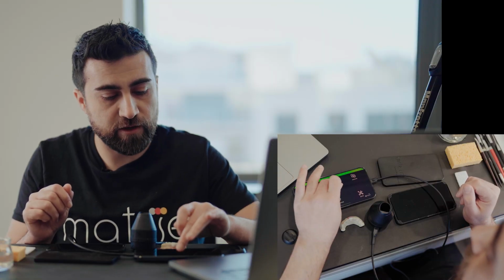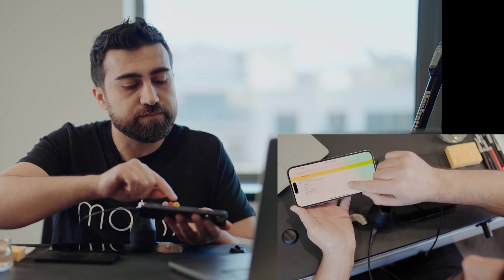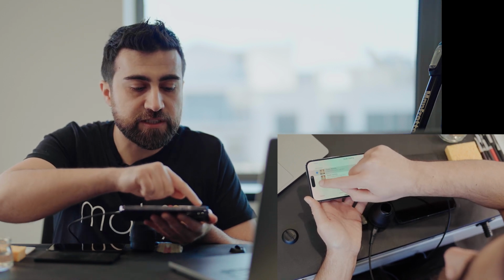To use the Matisse Staining Studio, we need 2 images: the target tooth and the crown on the aesthetic model. So I go back here, go to gallery, and select the patient, so I have all the images in the same folder. I click on edit and select the images that I want to share to Matisse.